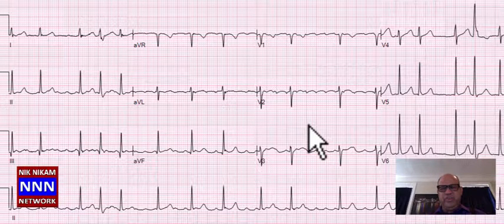I would suggest you take a notebook and go back and listen to this at least 1 to 2 more times. Then make note of everything new that you learn from each electrocardiogram. When you put all these new findings and fix those images of the electrocardiogram when you are working in the emergency room, in the operating room, or in the ICU, the moment you look at those electrocardiograms, you should be able to instantaneously figure out what is happening on the electrocardiogram at least. Then you correlate that with what's happening at bedside, then you will be able to put all the pieces of the puzzle together.